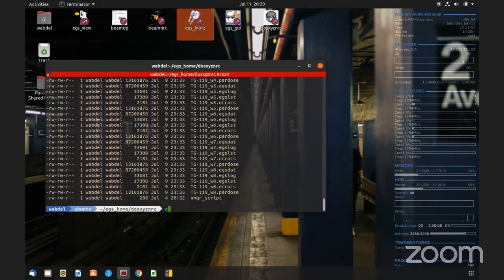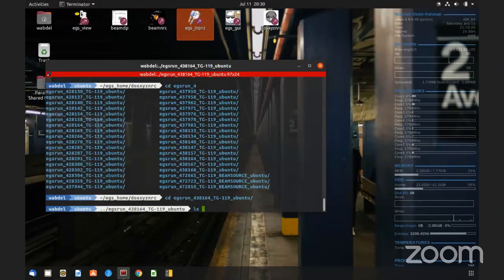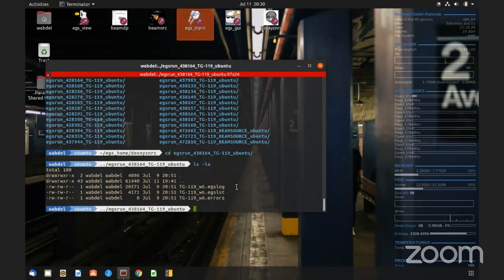Let's see if I have one at 8.164. Okay, it has been copied outside. So for example, I know from the title, this was for TG119.